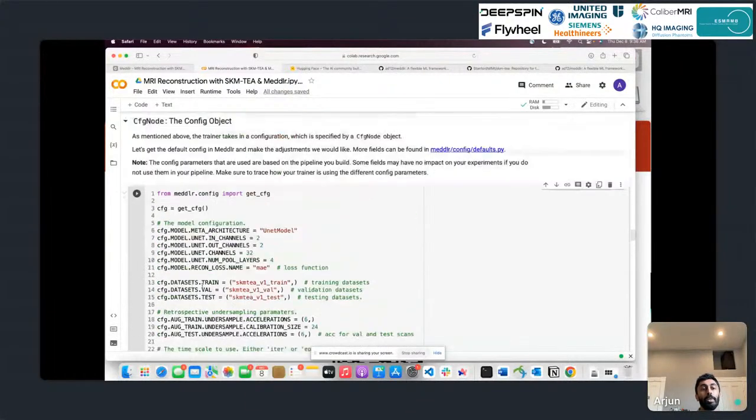And as I mentioned, this is all being done in a Python environment. But really what we may be interested in is having some kind of file structure for writing this config, either in an automated way or manually, and being able to tune different hyperparameters. So this config is actually written out to a YAML file, which is a file format that looks like a dictionary in file syntax.